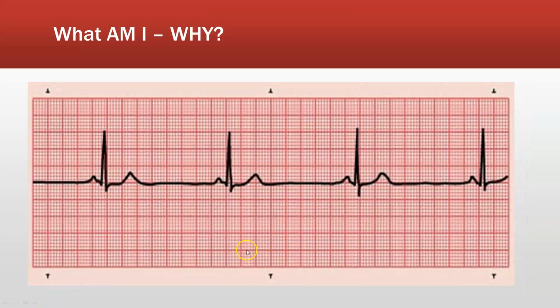Same as this one. Nothing has changed here except the rate. This is a sinus bradycardia. You're going to treat them if they're symptomatic. Again, we could potentially give medications to increase their heart rate if it were a critical care scenario. But more than likely, it's probably because they have previous myocardial histories, or it's because we've given them medications that slow their heart rate.